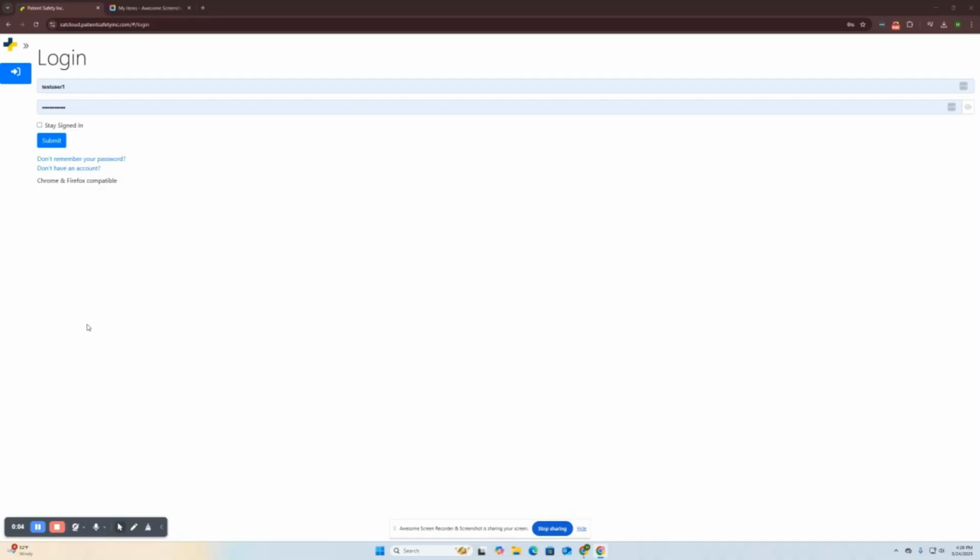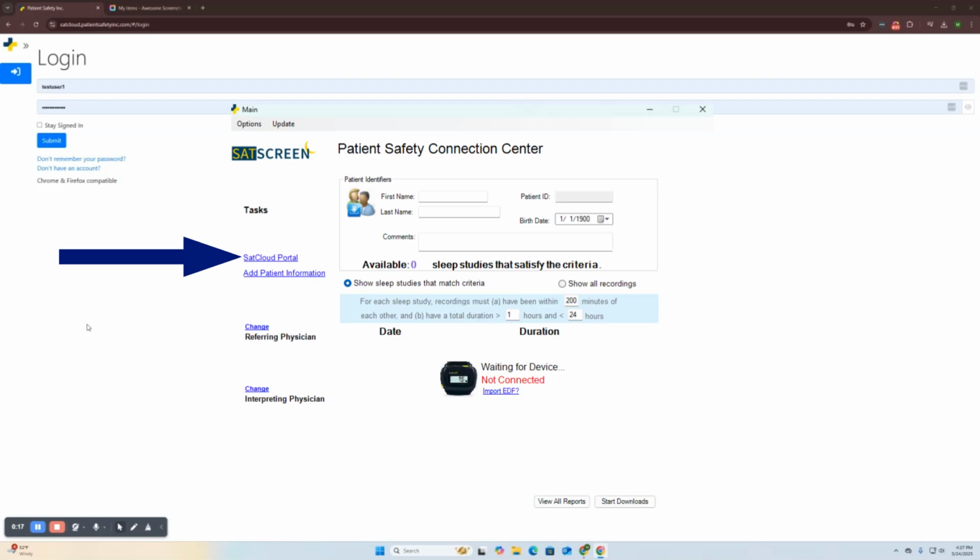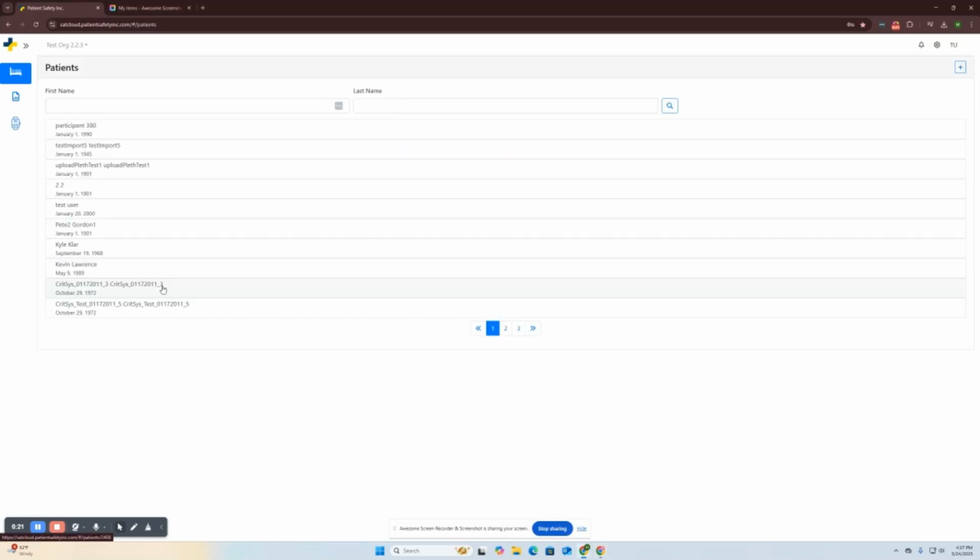This is the instructional video on how to navigate SatCloud. You can log into SatCloud through two ways. You can open Chrome or Firefox and go to satcloud.patientsafetyinc.com, or if you have Connection Center, you can open that and click on the SatCloud portal hyperlink.